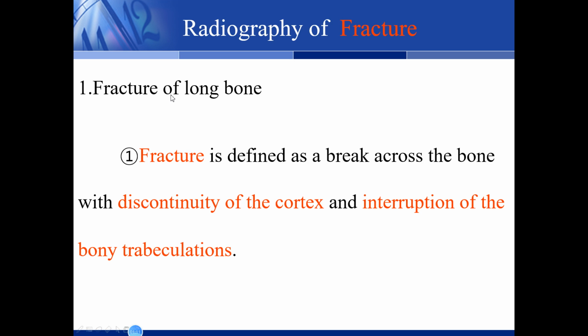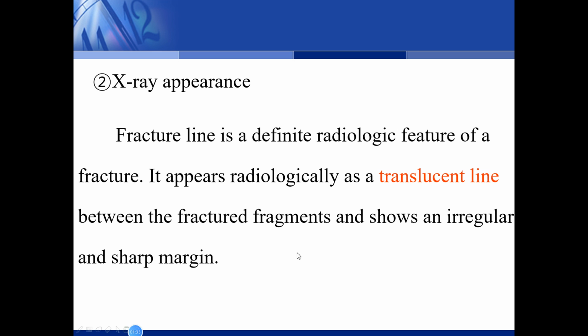Radiography of the fracture. Fracture of the long bone. Fracture is defined as a break across the bone with discontinuity of the cortex and interruption of the bony trabeculations. It includes discontinuity of the cortex or interruption of the bony trabeculations.